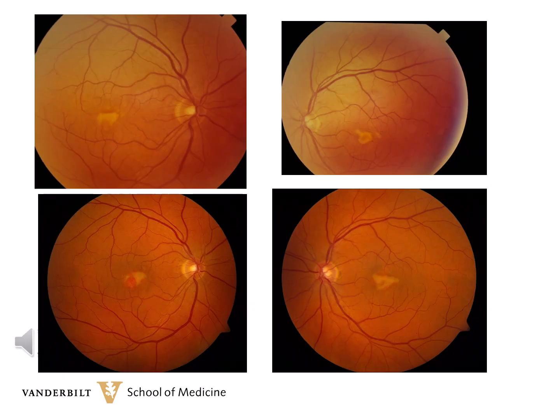We've seen this 48-year-old gentleman previously. The top two photographs represent the clinical picture when he first came in with vision of 20/40 in the right eye and 20/60 in the left eye. 4 years later, you can see in the lower two photographs that each of the lesions have subtly changed. The vitelliform lesion in the right eye has now been replaced by some atrophy centrally. The vitelliform lesion in the left eye has an irregular shape, but no atrophy at this point in time.